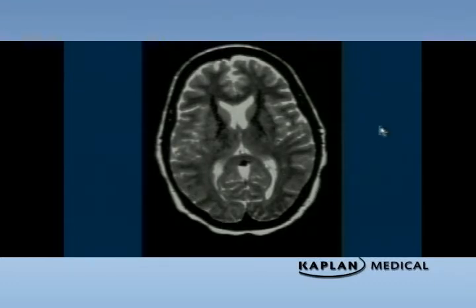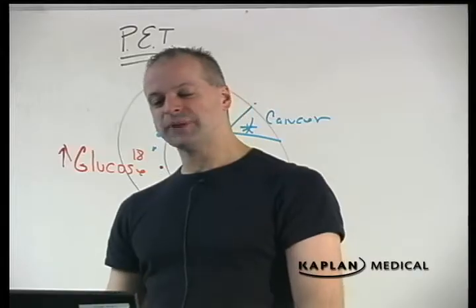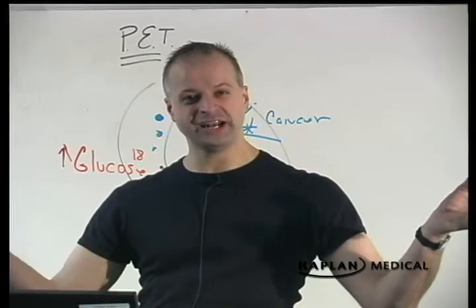And now let's say that you don't know what a normal structure is. Look on the bright side. Does it look the same on the other side? You got two at the same time and they look equal? It's normal. We are made in mirror images on both sides of our body. So if the other side looks the same as this side, it's normal. Normal MRI. Look, absorb, meditate.